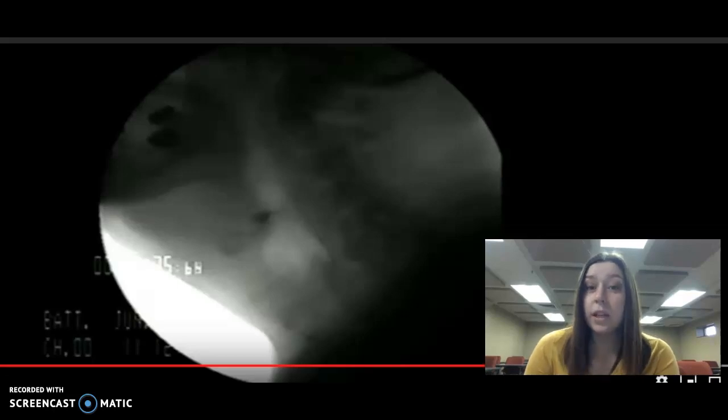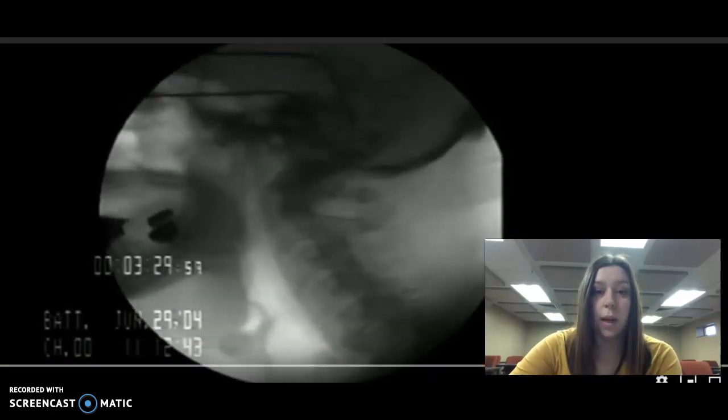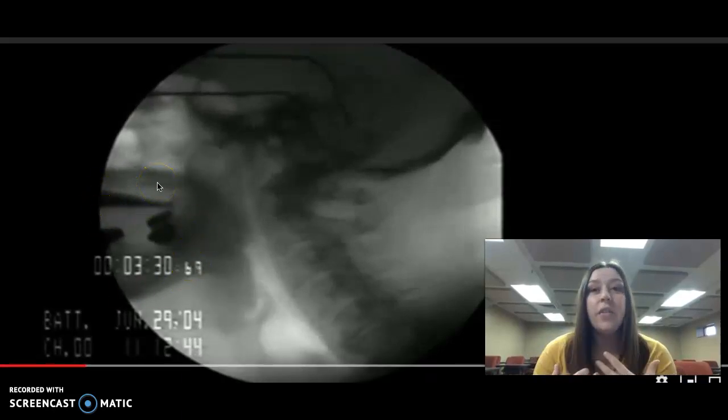So today we took an x-ray of you swallowing and recorded it, and I wanted to sit down with you and kind of look through the footage. So if we start at the beginning here, remember we gave you some liquid to drink, and here it is entering your oral cavity. Your oral cavity is just the inside of your mouth, which when you chew food, your saliva helps break down your food, or when you get a liquid like today, it just contains it.